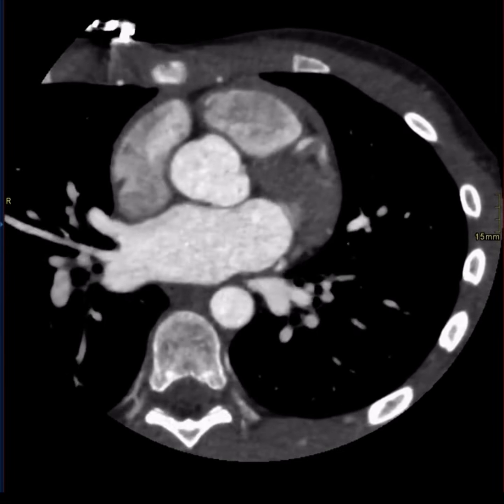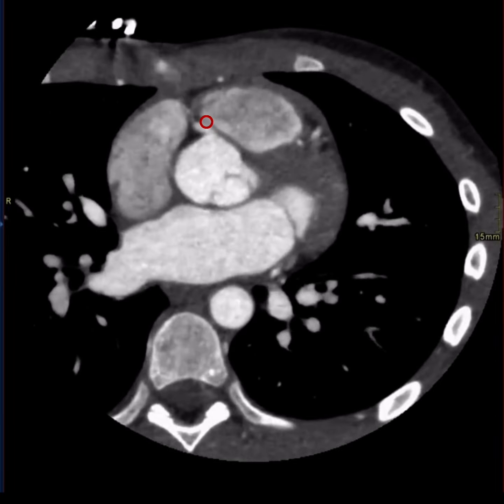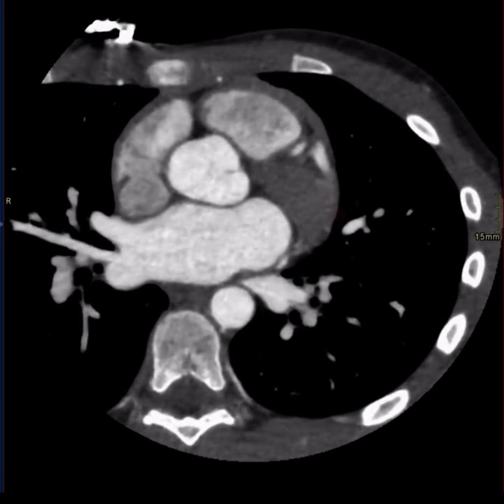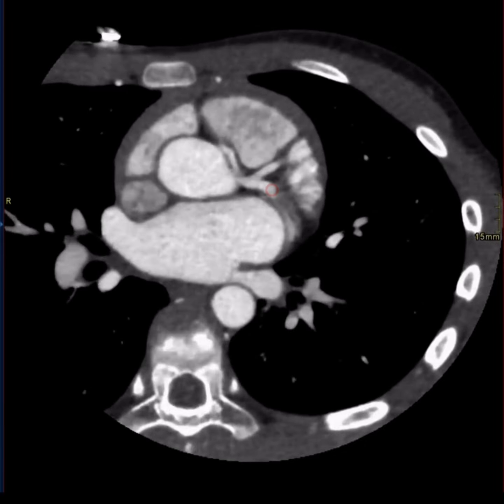There are also other malignant variants. Another example is a right coronary artery that originates from the left coronary cusp, and this can also have an interarterial course, but you also have benign variants where there is no compression.